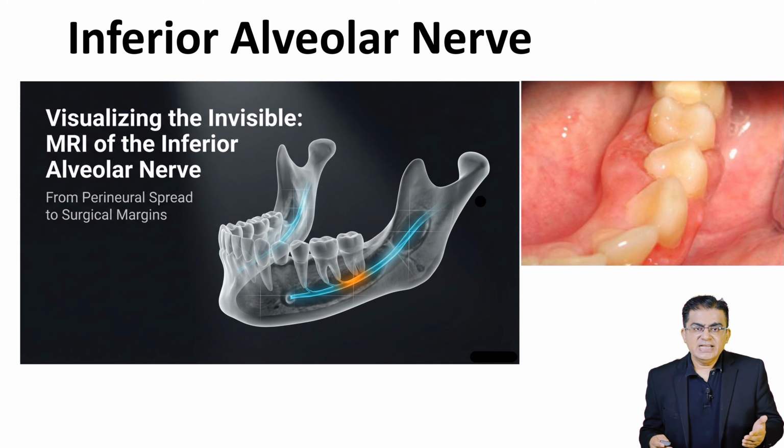If you just blindly rely on a standard CT scan here, it will only pick up nerve involvement at a much later stage. It waits until there is an actual physical widening or erosion of the mandibular canal. This is exactly why we need MRI.